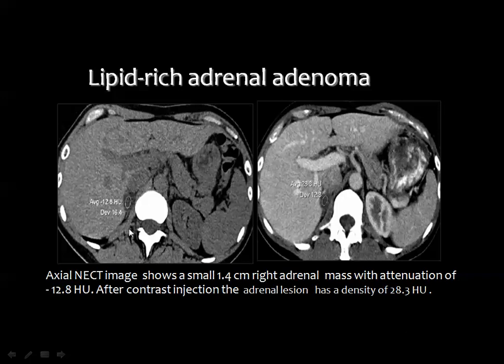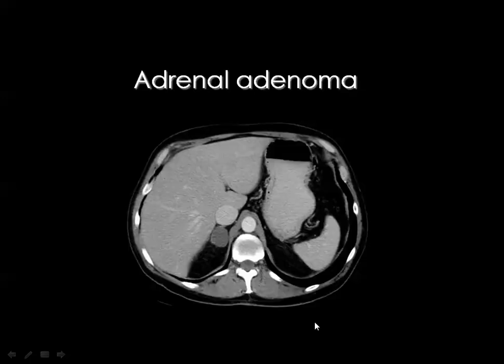And here is an example. You see, this adenoma measures minus 12.8 Hounsfield unit in the pre-contrast study. And after injection of contrast, it will enhance similar to any other structure, which does not have an effect on the diagnosis.